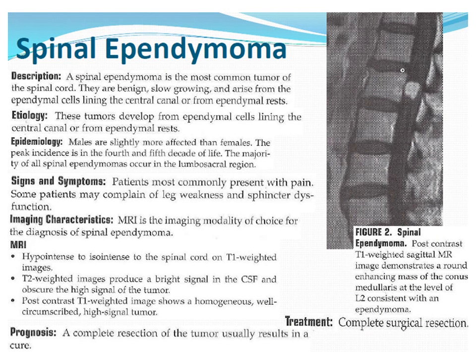The importance of recognizing this lesion is that this one is a post-contrast image, and it shows up really beautifully on the study, but if they weren't expecting it, if they were thinking that the patient may have weakness and pain from just a simple herniated disc or something like that, then they wouldn't have a full evaluation of the ependymoma.